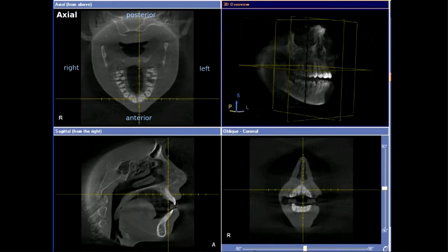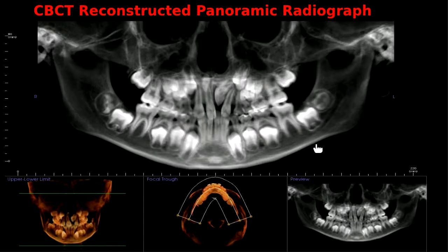And this is just a volume rendered image, so you can see kind of a Ceph, but what you really need is axial, sagittal, and coronal. You need them. You have superior, inferior, anterior, and posterior, so you can see that too. Again, in the coronal view, you have superior, inferior, left, and right. This again you will have in your exam question.